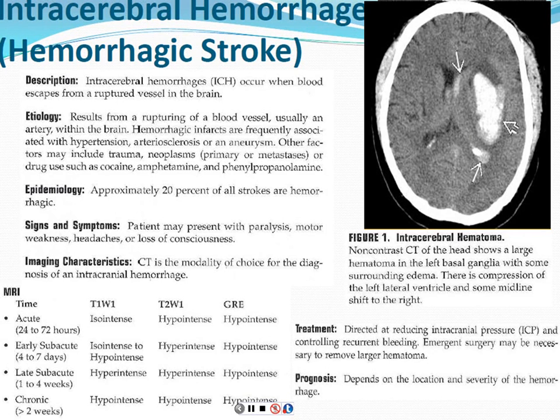with CT. Where MRI may come into play a little more often later is we'll recommend that when the patient's hemorrhage gets reabsorbed and resolves, and all the acute issues go away, they get an MRI with contrast to make sure that there's no lesion underneath there that caused this hemorrhage. Now, if it's in a characteristic location like this in the basal ganglia and the patient's blood pressure was 250 at the time, you can be fairly confident. But if it happens in an unusual location, then you want to start to think about the possibility that it was either a metastatic lesion that bled or something like an AVM that we can treat.